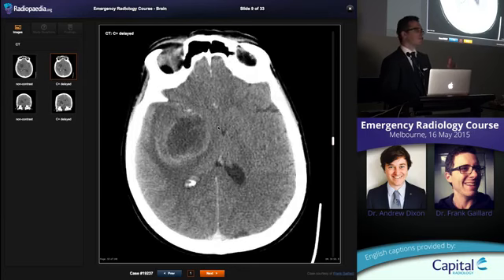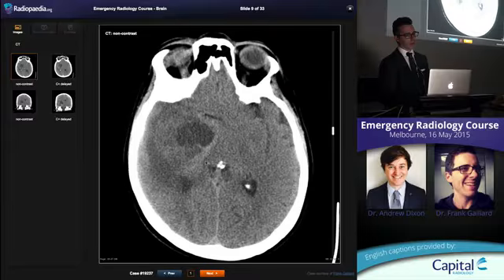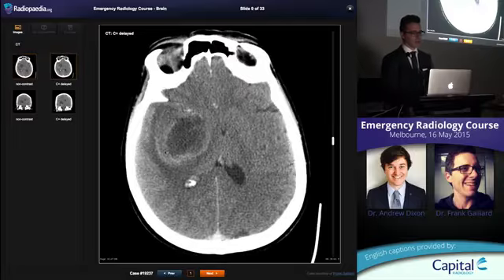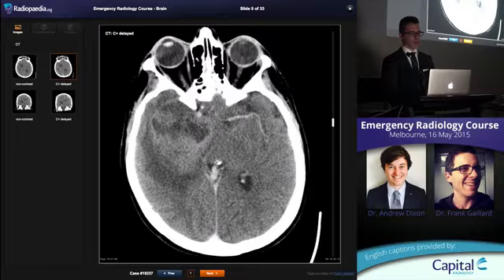The reality is you can't be certain of what this is on CT. They need an MR, and even with an MR, they will still need histology, but you need to identify that these patients are here. In this case, you have a low density component, and you have a lot of midline shift with that uncus pushed straight across. When you give contrast, you see peripheral enhancement, it's nodular, it's ugly, and there are components that are thicker and larger. This is a typical appearance for a high-grade glioma.